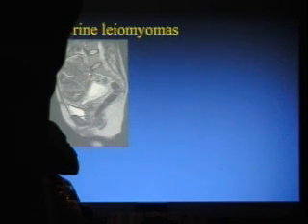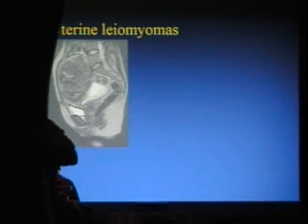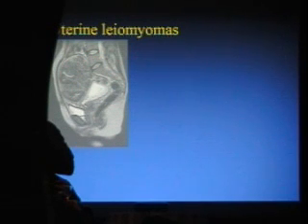Here's an example of a patient who was pregnant, and she's got this very large, slightly heterogeneous leiomyoma. The classic ones are homogeneously low signal on every pulse sequence. They're usually very black on T2, with cookie cutter sharp borders. This one has what's known as hydropic change, or change of pregnancy. Because of the stimulation of the hormones, the fibroids look different in pregnancy.